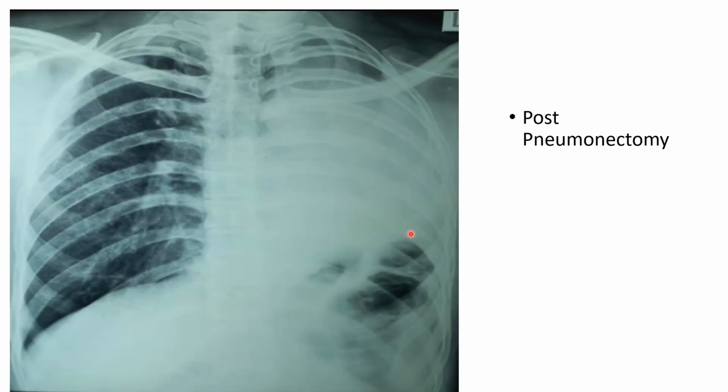This is an interesting X-ray. Here there is a left whiteout and there is volume reduction. Why am I saying volume reduction? This diaphragm is elevated. See the diaphragm here, and you can see the diaphragm here. The diaphragm is elevated here, and then you see this right lung is hyperinflated. Why hyperinflation? Because normally the right heart border will come somewhere here, but we are finding the lung till this area. And you can see the trachea here, and it goes to the right main bronchus here, and of the left main bronchus only the stump is seen.